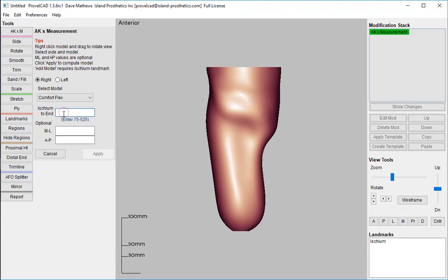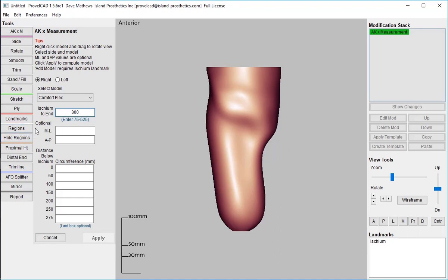And we'll key in a length measurement. This optional one I don't tend to use too much. I have an AP. If you do use them, I would just choose the one that is most important for the patient. My tools measure AP more effectively, so that's the one I'm going to key in. And some circumference measurements.